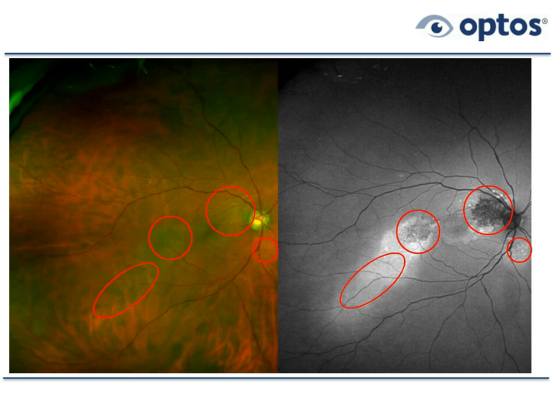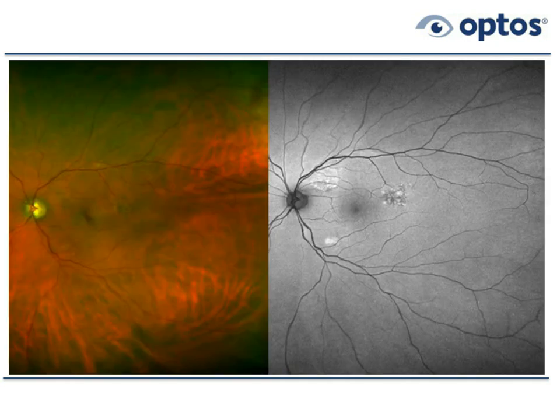This patient has central serous. We know that because we've done OCTs and also fluorescein angiography to actually show where the leakage is. OCTs are very, very useful in these cases as well. But it's amazing how many patients we see with central serous that actually don't know it. So these are patterns that sometimes, if the fovea is not involved, the patient may be completely unaware of it. Even in the left eye, which is much less involved, there are 3 lesions, and those 3 lesions are pretty much invisible to ophthalmoscopy, but easy to see with autofluorescence.